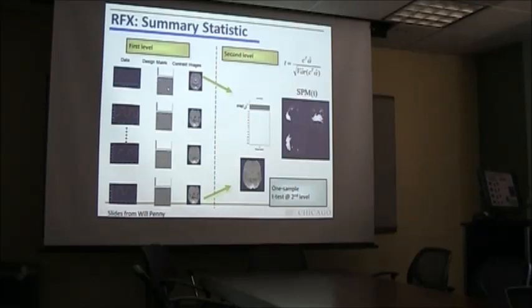But it often looks like this sort of grayscale square. It shows here these contrast images, so images for each subject that at each voxel have a value of how well one part of your model fitted the response better than some other part of your model. And you would use these contrast images at a second level, group level analysis.